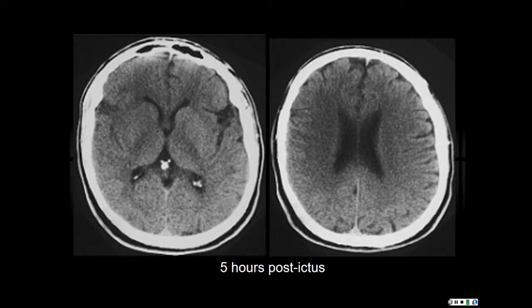Alexa, did you notice that when we put this up? Did anybody notice that when we put it up? Why? Because you didn't know where to look. Well, guess what? Now you know where to look. So, the basal ganglia has been affected.